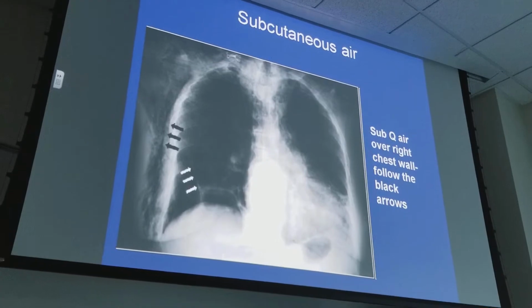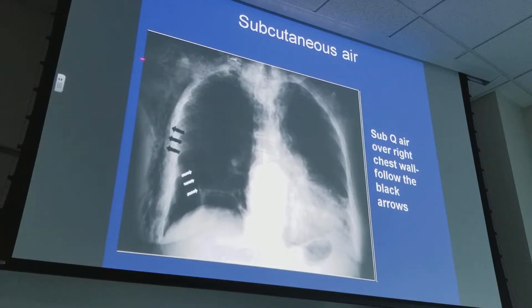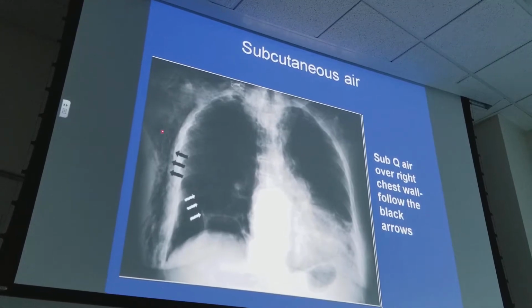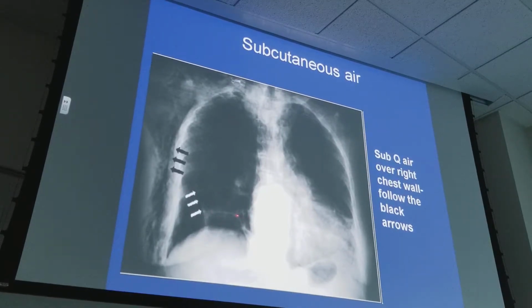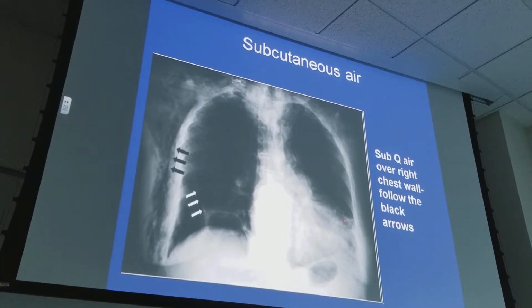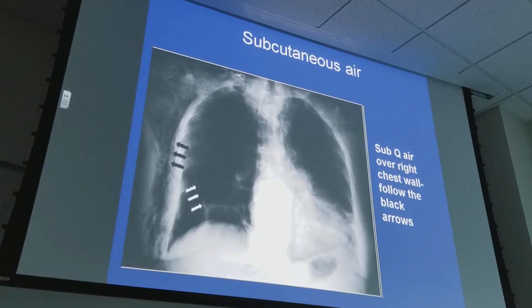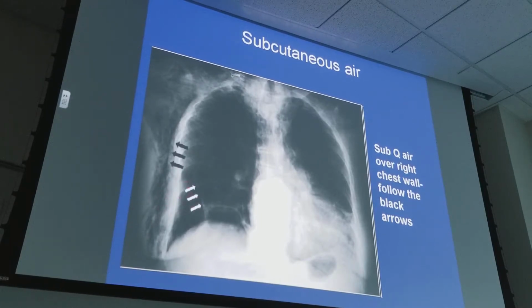So look at this X-ray here. You see all this kind of haziness here, right? Doesn't look normal, does it? This is escaped air into the soft tissue. It's dissected through the tissue planes. Looks like this patient has blebs or bullous emphysema, which are non-functioning alveoli that kind of blow up, right? They don't function anymore. They're distorted. They don't have pulmonary vasculature around them. And when they pop, they can cause an air leak into the pleural space. So you have a pneumothorax here.